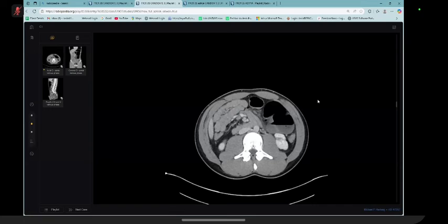Mostly this is a cecal volvulus, and I couldn't see any evidence of pneumatosis intestinalis or pneumoperitoneum. However, I would check in the lung window. I will convey my findings urgently to the GIT surgical team for discussion and appropriate management.